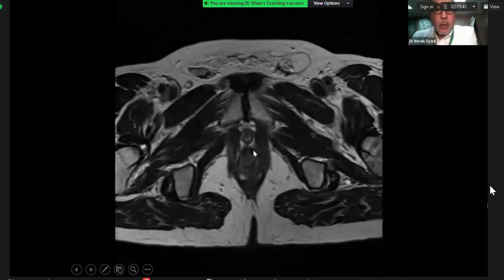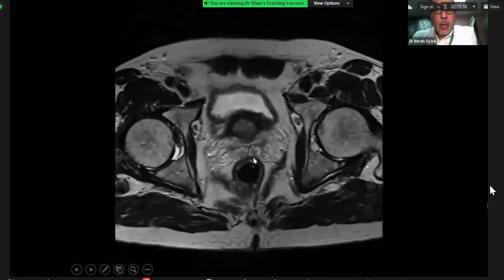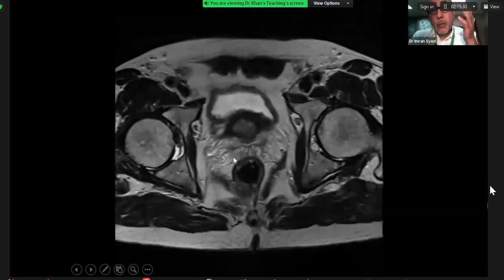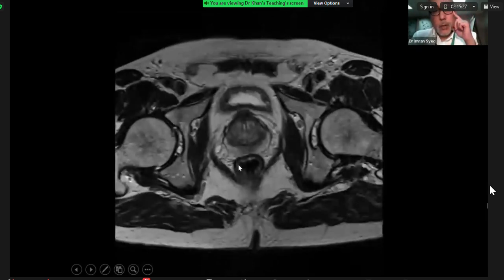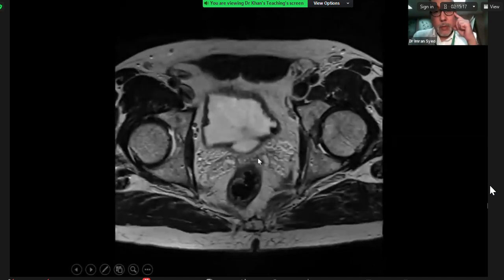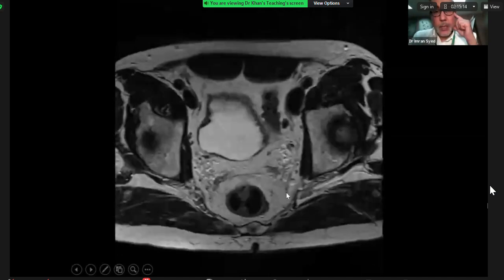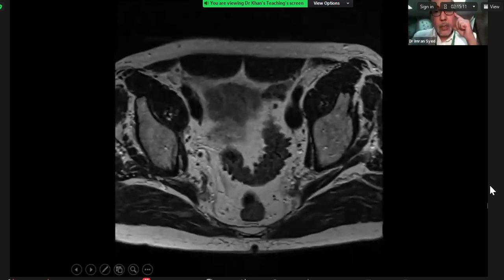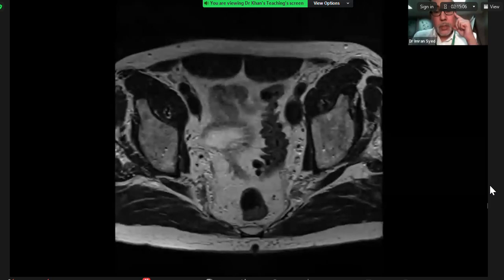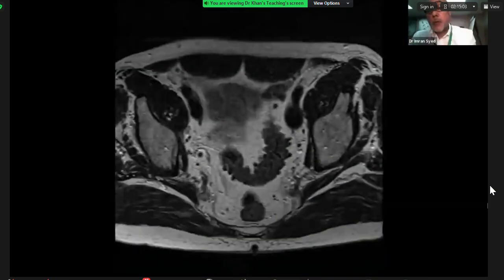So the interface between the rectum and the prostate needs to be defined. What's important in MRI prostate imaging, particularly when you've got evidence of possible tumoral spread, is to talk about the rectoprostatic angle, because that preservation is crucial in terms of the disease management of the patient. Obviously, what's important is the seminal vesicles as well. And what's also important is defining the places of nodal involvement. So where could the lymph nodes be?